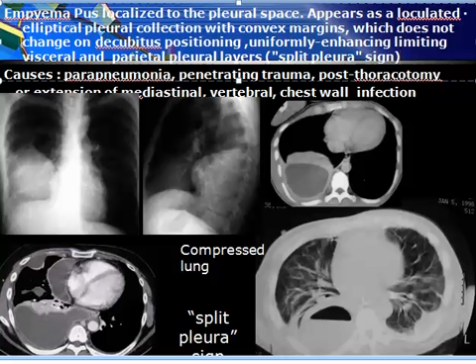and it may show fluid, and definitely should have a thick enhancing margin, and it may be seen as more than one loculus. So here it's anterior, pericardial, and in the fissure, as well as posterior. We find four locations for the collection.